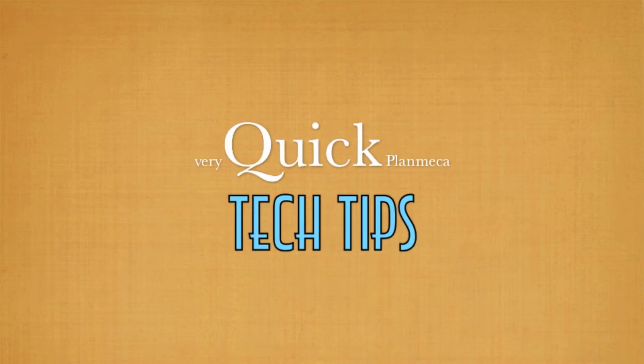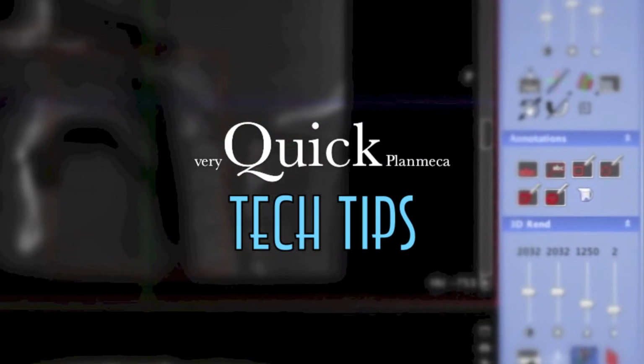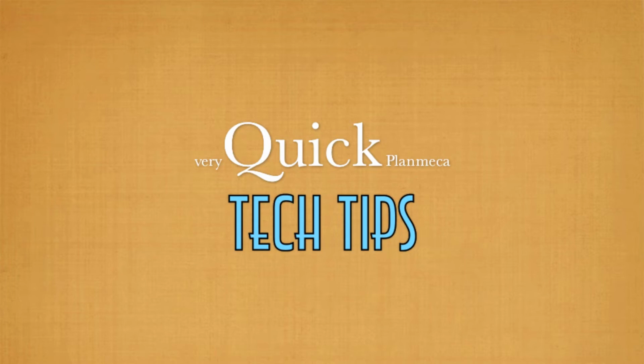Okay, today we're going to be talking about the 3D region growing tool inside of Romexis. Now I know that's a mouthful, but this tool is actually very useful, especially when it comes to airway analysis. A lot of people aren't really sure how to use the tool. So that's what I'm going to show you how to do today. Let's get right down to it.